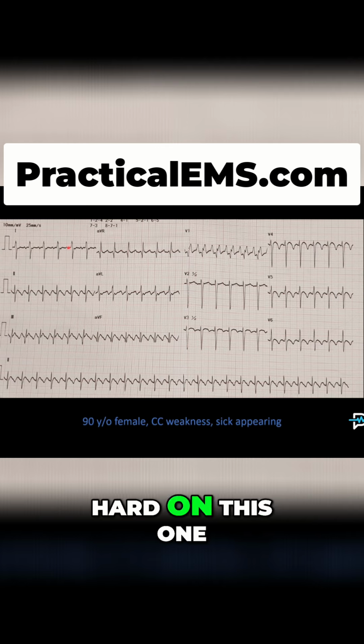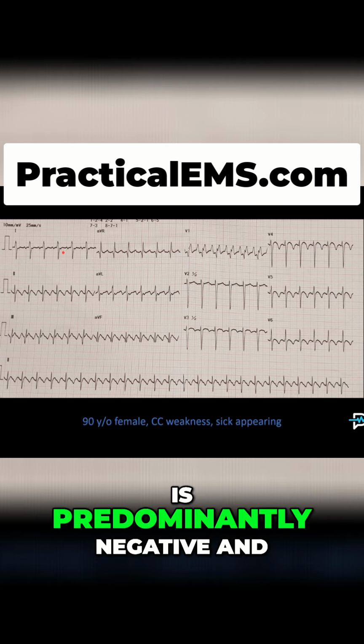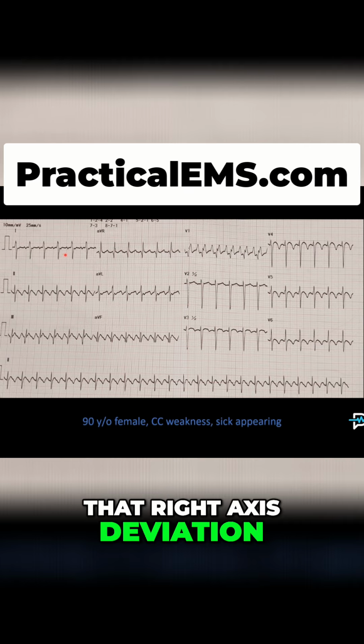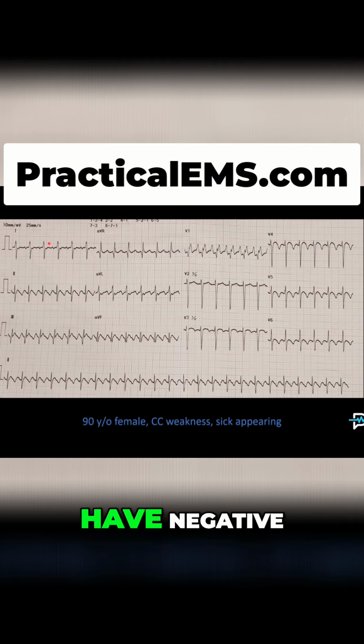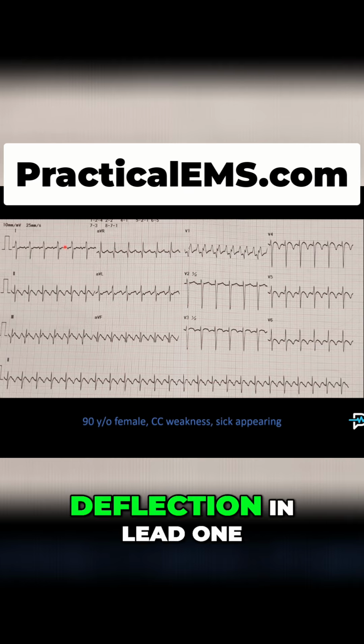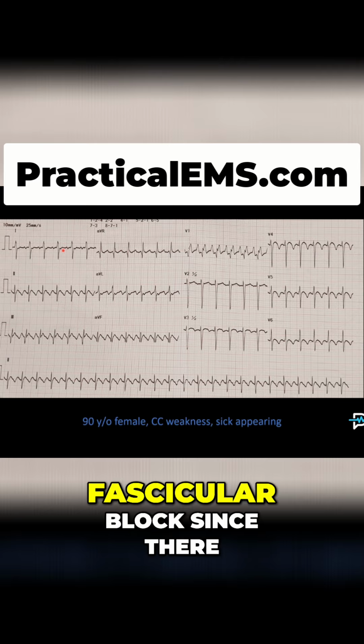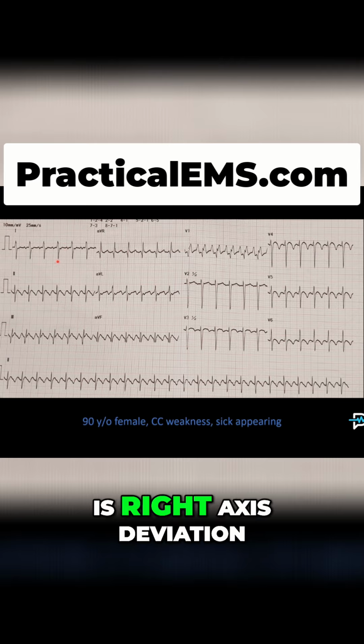Axis is kind of hard on this one, but since lead 1 is predominantly negative and it's pretty isoelectric here and here, I'm tempted to call that right axis deviation because that's the only one where you're going to have negative deflection in lead 1. So you have to look for a posterior fascicular block since there is right axis deviation.